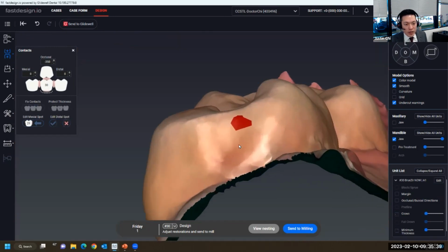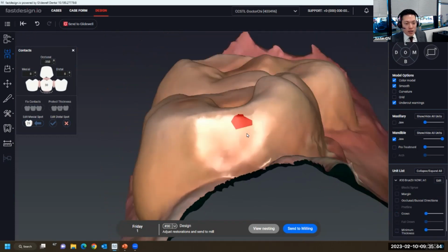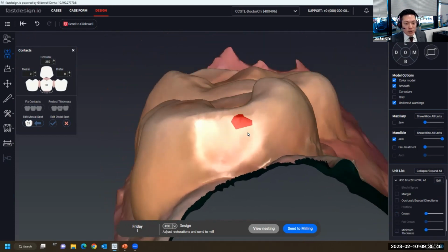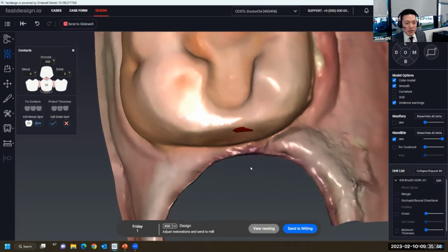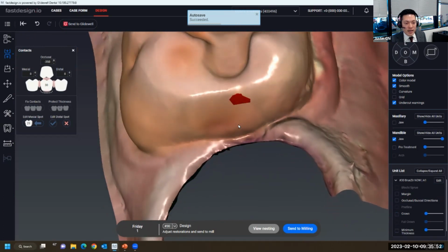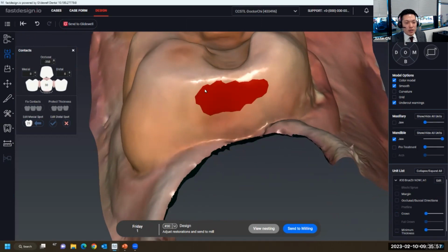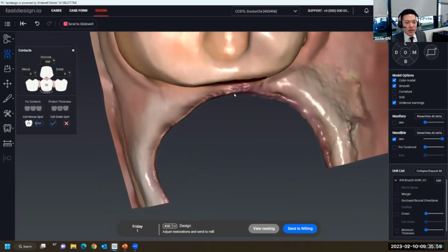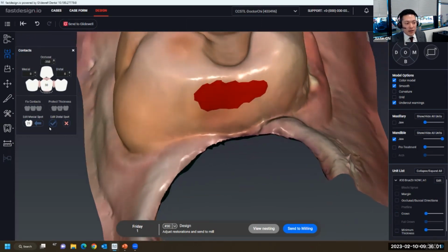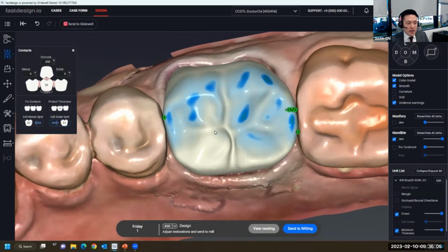And so you can see we're straight on the mesial surface of number 31. Before I just draw it, the highlight of the software is really cool, the lighting, but let's just look at it from the top, from the occlusal, visualize the surface that's facing your design, and then you can generate a better, more accurate contact surface that way. So that looks pretty nice there. So let me hit accept. Okay, now notice nothing happened yet. Nothing will happen until we hit fixed contacts. This will automatically define those surfaces.